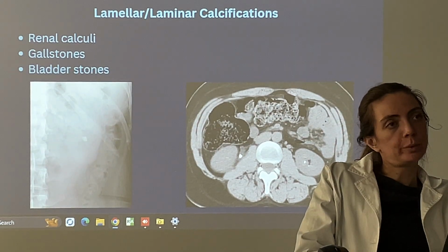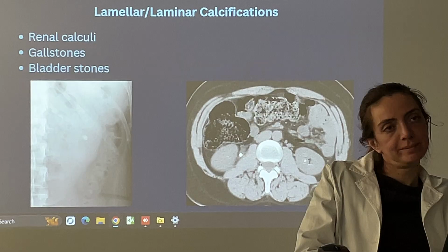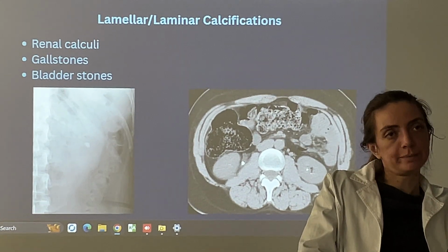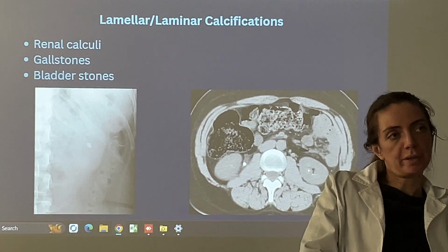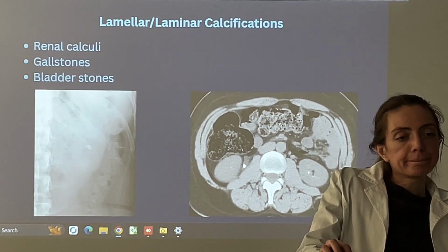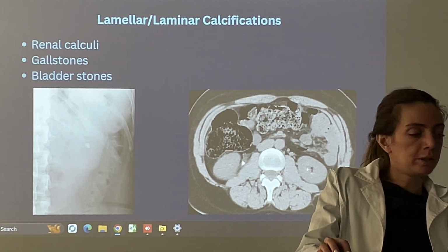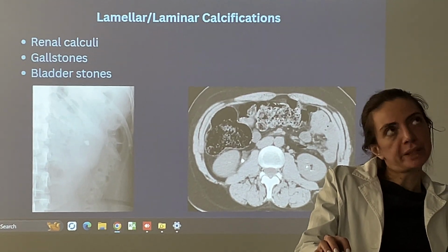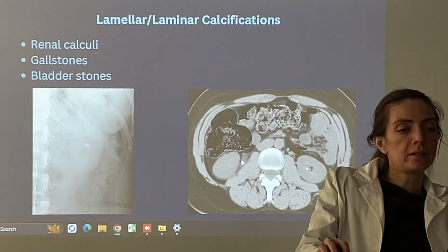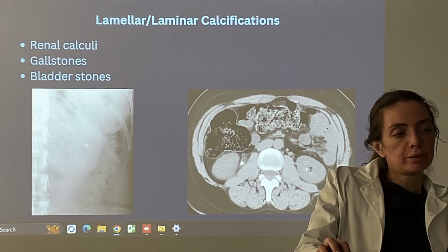Yeah, because we study topography. That's it. What else? CT, okay. What has the doctor sent to sonography? Bladder stones usually develop secondary to chronic bladder outlet obstruction, and they are very prone to develop lamination. So what can you see in the first image?